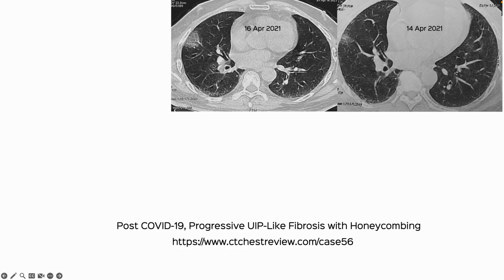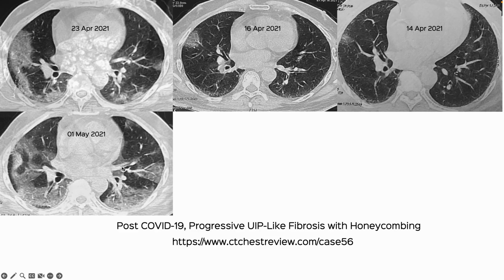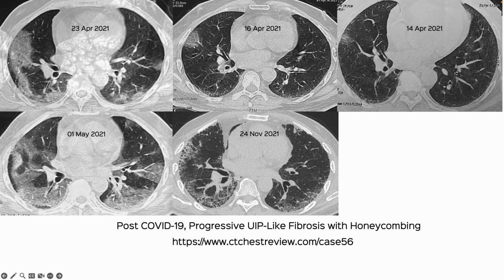If you take this patient, April 21, mild disease, about 2 days later, the disease has progressed. Then there's this classic exudative phase, and here you can actually say this is an organizing pneumonia pattern. Then it becomes more diffuse, but we had seen it as an organizing pneumonia, so we can keep using that term. That's the organization phase where you see bronchial dilatation, reticular opacities, but now you're starting to see some cysts here, and that actually portends a possible problem.